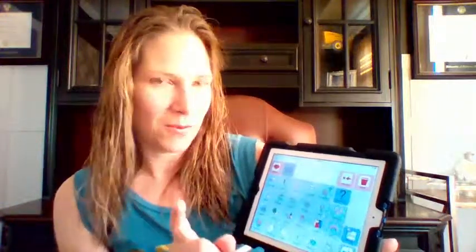I did end up finding the word help though, and it was under actions. So it's really important, just as it is for our kids to have time to explore these vocab sets, it's important for us to have time to explore them too. So it makes sense now hearing that help is under actions, because it is an action. I did find it here under more words. There's help. Help.